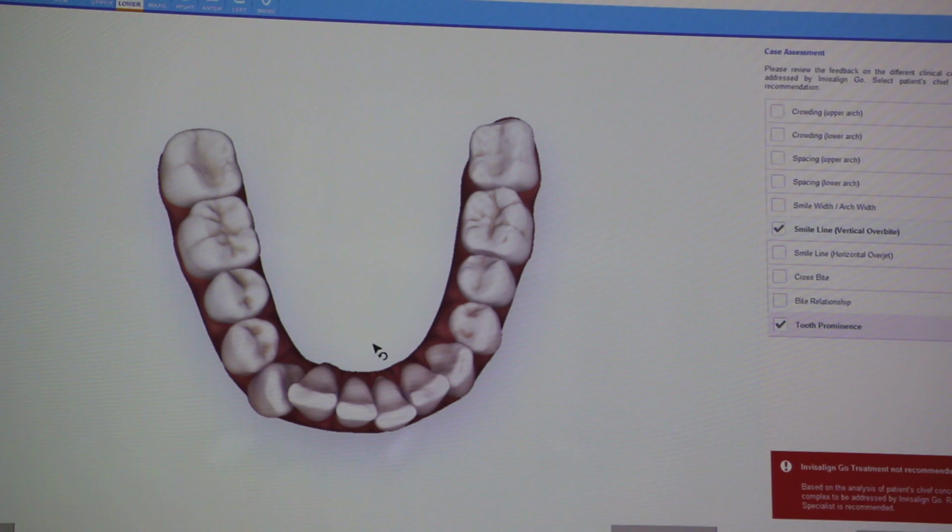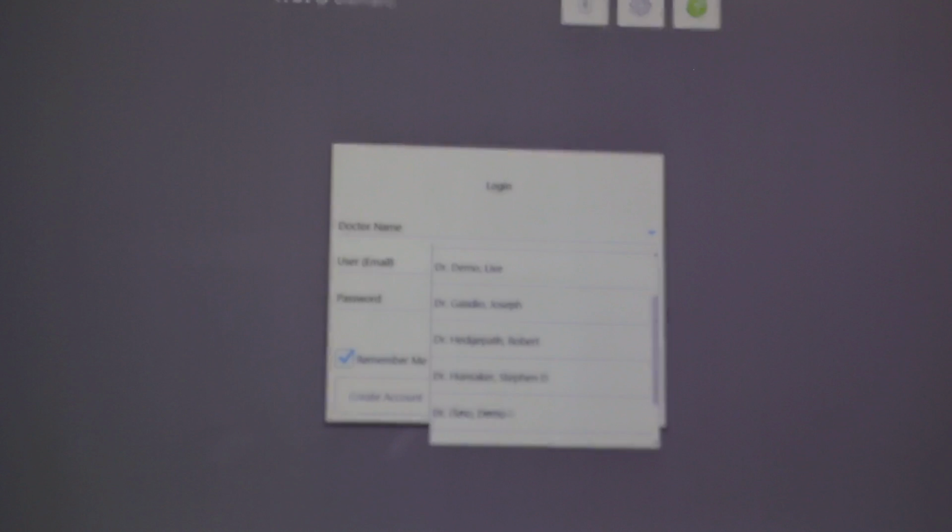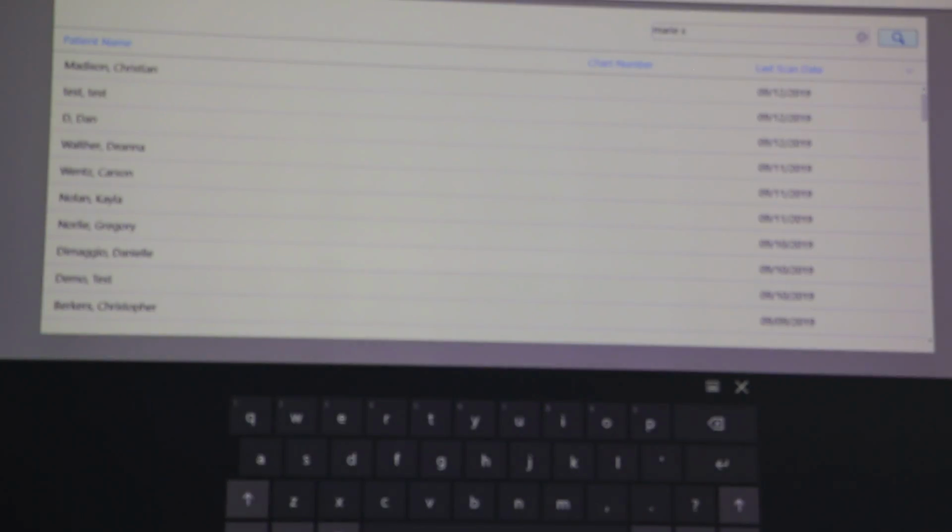Okay. All right. Travis is going to show you another little thing that we dipped into a little bit in the other room, the time-lapse thing, but I want you to see it on a big screen, what it actually looks like. And I use time-lapse for all kinds of reasons, especially in hygiene appointments. But it's really cool if you're doing an Invisalign case, and it's a mild case, and the patient comes to see you after like 10 weeks, and says, I'm wearing my aligners, but I don't think anything's moving. Because patients can't really tell if things are moving, because every day it's so slow and gradual, they can't see the distinction, right? You and I can, because we see them every month or 6 or 8 weeks.